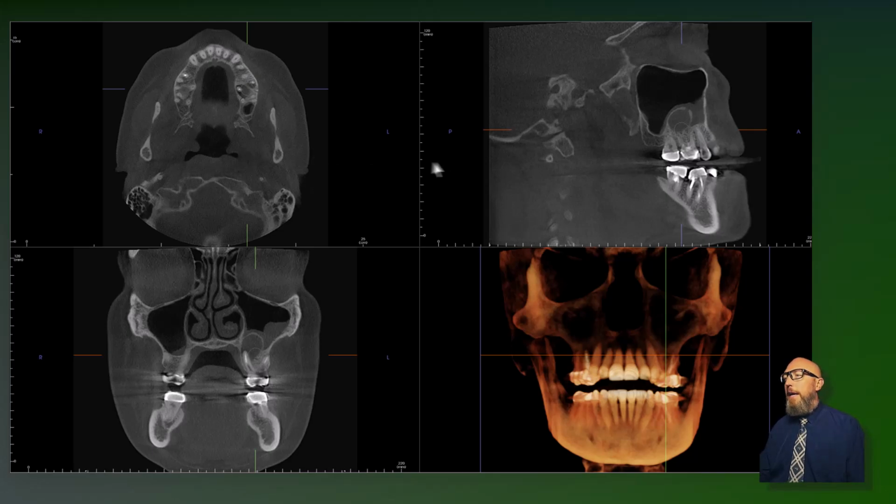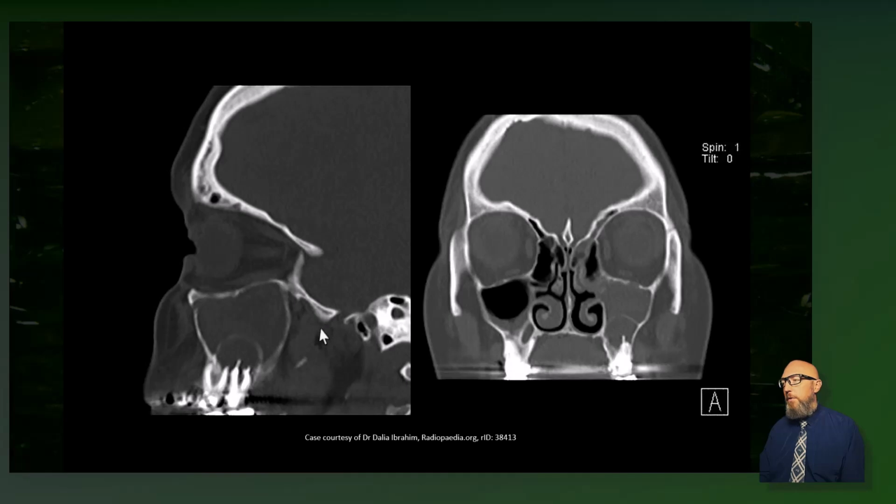All right, and this is displaying, again, our MPR view where we have the axial slice. In the sagittal slice, you can really appreciate this odontogenic lesion kind of expanding into the sinus, and there's a small 2 to 3 millimeter communication in the sinus. And this is how odontogenic sinusitis happens. You start to get drainage into the sinus that fills with fluid, and that could lead to a sinus infection. In this case, all I see is some localized mucosal thickening, probably some related mucositis. But then here's a case where it went into full-bore sinusitis. As the inflammation started to leak into the maxillary sinus, it occupies now the entire sinus. And once it starts to obstruct the sinus drainage, as we see here, then that leads to sinusitis.